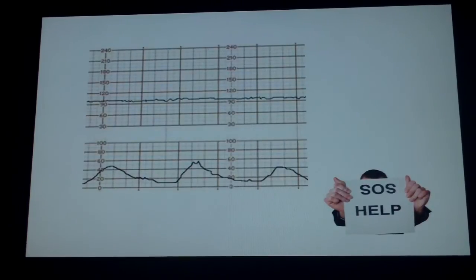Now that's ugly. That's just plain ugly. And I know that if you guys had something like that, you wouldn't think, oh, this baby's probably okay. You would definitely do all of your intervention measures and further investigation as to why this baseline is so low, with notifying your provider to do a bedside evaluation, things like that. And if that's pit on, you're going to turn that off, obviously.